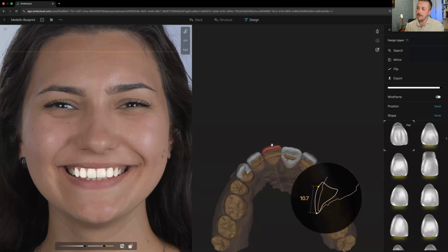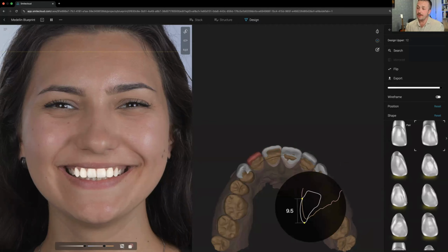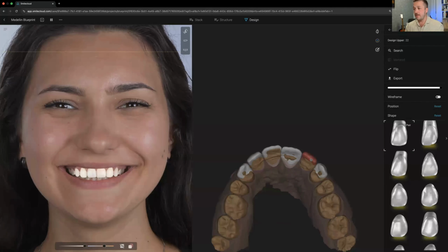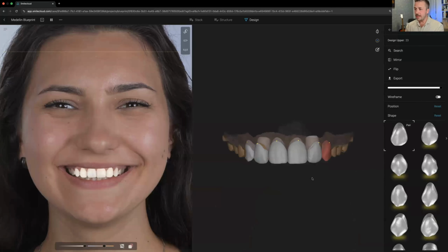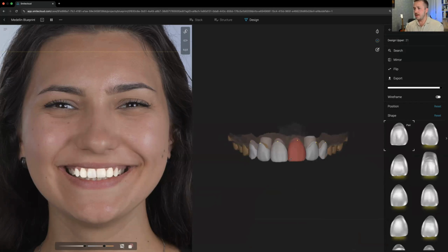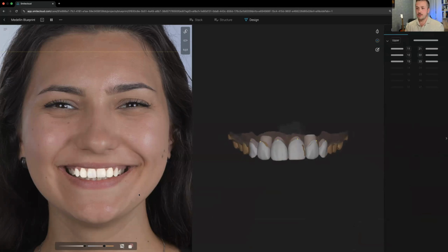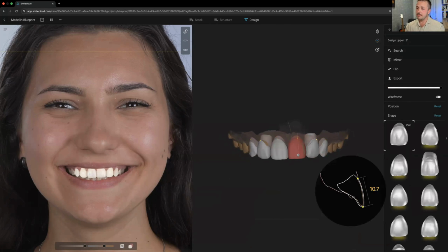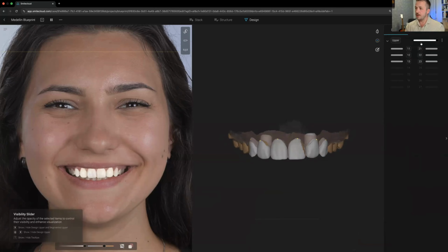And this is really, let's say, really well accepted by the patients, as you can imagine. But also, this is a really good way of having a constant idea of the design with your team, and your team being completely aligned with everything which needs to be done. So you can always have your design ready at any point, and everybody from your team can actually see it. So let's say in this case, it's still not perfectly good, but just not to waste too much time, let's say that this is something we are actually good with.